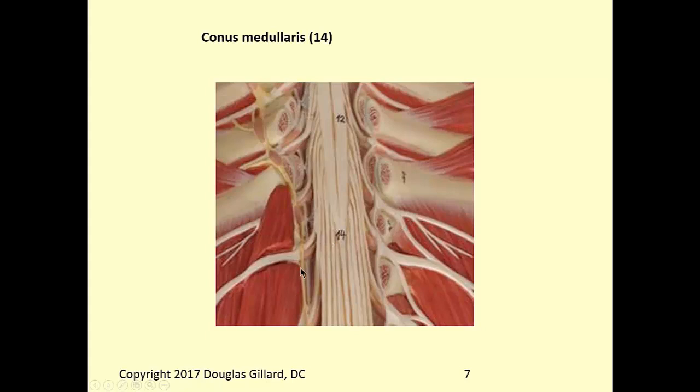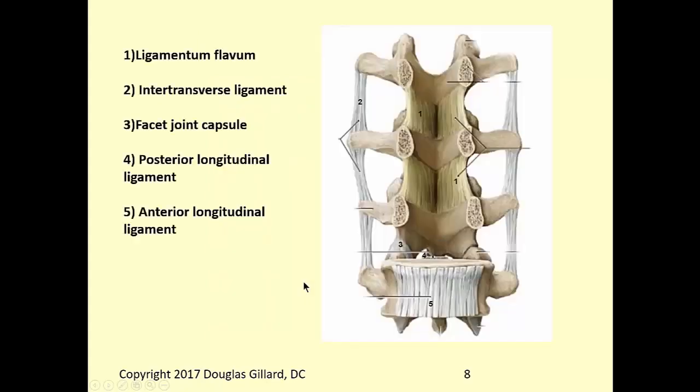Sympathetic chain right there. Lumbar spine pain is actually carried within that thing. Okay, here's some important ligaments. So here's a different view. Now this is an A to P view. Here's the front of the vertebral body, transverse processes.